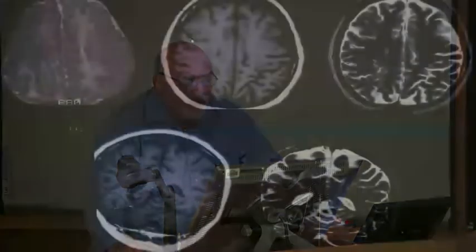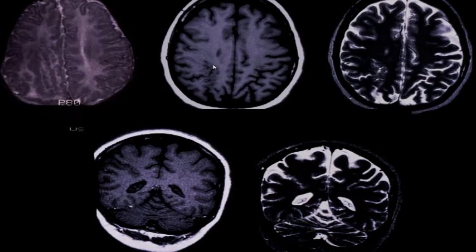Whatever, if you do CT, if you do ultrasound, if you do MRI, if you give contrast, it will act like gray matter. It'll be the same sequence, same signal, same attenuation, echogenicity as gray matter. It's just an abnormal spot. This can be a common thing that you might see. They might show you on the boards, or you might see in real life, in the periventricular region, these little nodules of heterotopic gray matter.